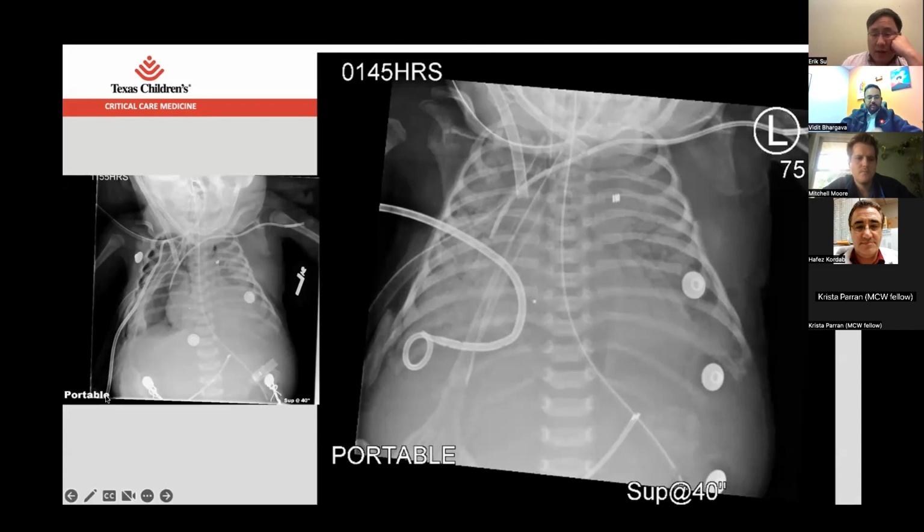And if I could just show real quick the point that I think you're making, Vidit, that's super important, is that no one's looking for this to replace X-ray, but it ends up being a huge adjunct when we need imaging right now. Like, when you've got a kid on an oscillator, blows a pneumo, is about to code, and you're seeing SATs plummet, and everyone's got the suspicion in their head, and everyone just wants to know, is this a pneumo or not? But the ultrasound sometimes gives you that information before chest X-ray can get there.